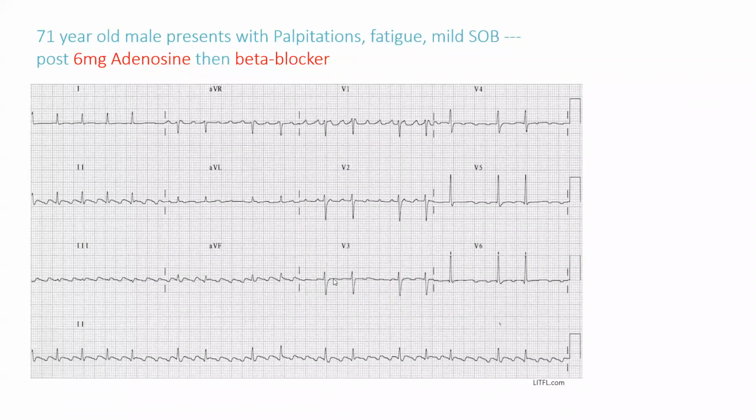So, it's kind of a spot diagnosis, actually, isn't it? So, I guess what I'm going to say here, describe this ECG. Again, we're running short on time, aren't we? Let's just talk about it. What is this? Go on. Somebody put in the group. What is this? Exactly. Yes. Thanks, Stephen. It's atrial flutter with variable block.